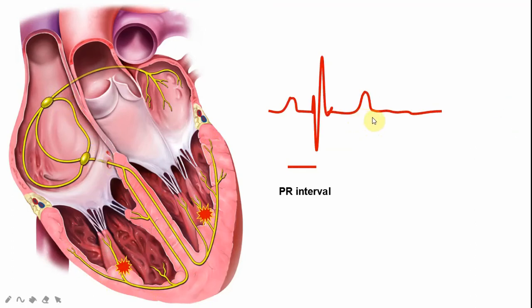This goes on and on. So, the normal ECG is very easy to comprehend. One thing needs to be remembered is that the positive deflection of the ECG means that the cardiac impulse is passing towards the lead. On the other hand, a negative deflection means that the cardiac impulse is passing away from the particular lead. Excellent stuff, isn't it?